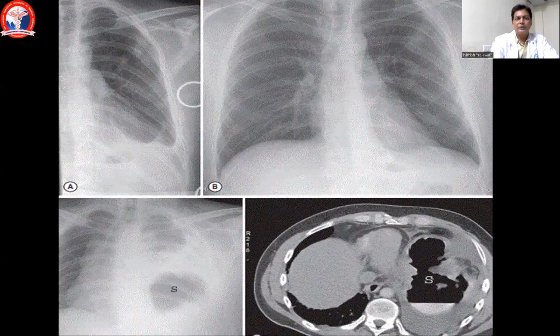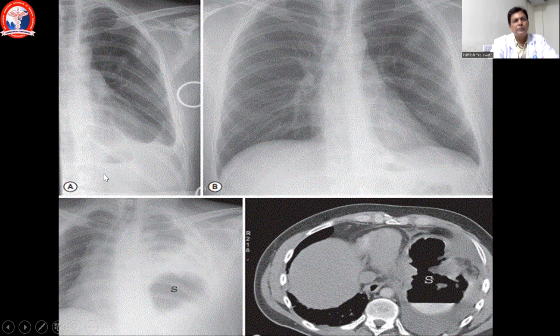We'll go through other images. What we see on the frontal radiograph is the left part shown here. This is a case of trauma. Post-traumatic X-ray immediately after trauma shows multiple rib fractures. Then hemothorax, the pleural space is occupied by blood, as well as lung contusions, rib fractures, lung contusions.